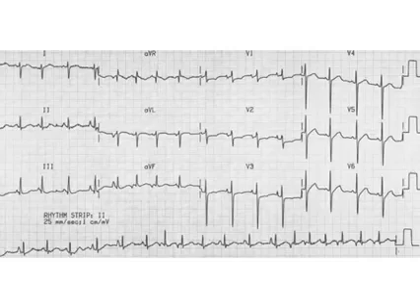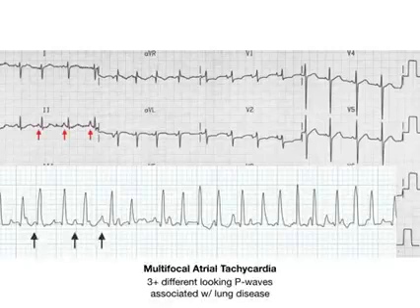Here's our next example. What do you see on this slide? Now this one I will tell you is probably the trickiest of any of the ECGs that I've included in this video today, but this one is really important to understand, and we're going to spend a little bit of time on this because I think that understanding this is very, very high yield. Pause the video if you need a few seconds, but I'll give you the answer. What you're seeing here is multifocal atrial tachycardia.